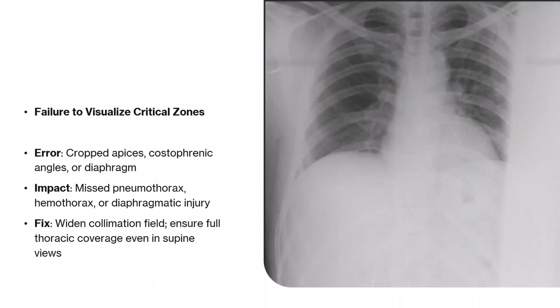Cropping of images or overcollimation in chest radiography is not recommended because it compromises both diagnostic integrity and patient safety. Trauma imaging must capture the entire injury zone, including entry and exit wounds, foreign bodies or impaled objects, and adjacent structures. Cropping or tight collimation may cut off key anatomy, leading to misdiagnosis or incomplete surgical planning.